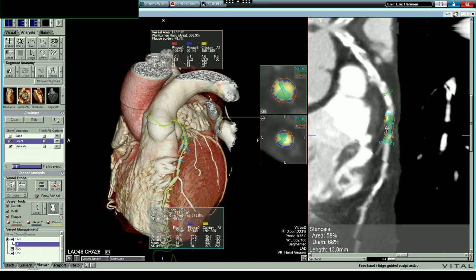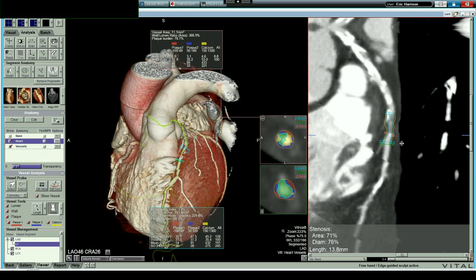We can move this along, and we'll give you here being where we're going to be testing, and then we can move this, and we get various numbers in here: 49%, 62%, 52%, 53%, and so depending upon how we're measuring that, and then we're trying to get this up here.